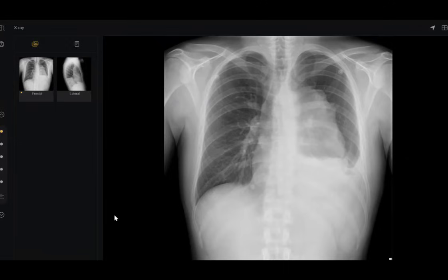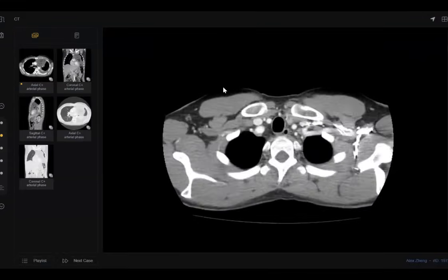What's your diagnosis? Sir, I believe this is an anterior mediastinal mass with left-sided pleural effusion, because the aortic knuckle and descending aorta are also well seen. What's your next step? There is also some tracheal shift noted to the right side. So my next step would be to do a CT scan of the chest.